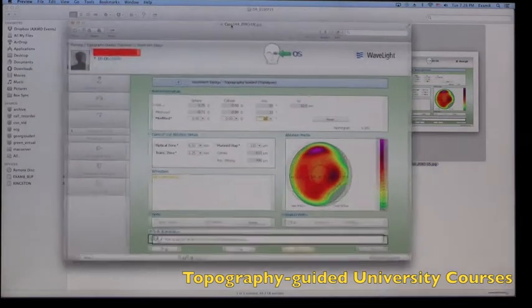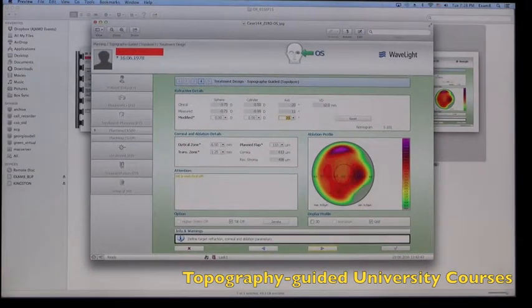On the top part are the clinical measurements, and this is the actual clinical refraction, which for us is a mixture between the dry and the wet manifest. Then on the middle row, there is a measured refraction, which is what the topographer suggests as a refraction. Of course, the sphere is really elusive because the topographer does not have any axial length data. So here we're paying attention to the amount and axis of cylinder.